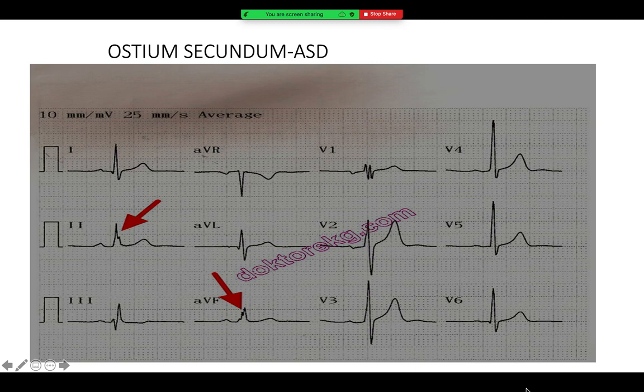So for example, how do we start seeing the ECG? What are the different steps for that? We start seeing, for example, rate. Okay, this is not a 12 lead rhythm strip or something. So rate, rhythm. Then, for example, what about the abnormalities like the P wave, the QRS, the different segments, and then on an overall basis as well, you can go for the final impression.